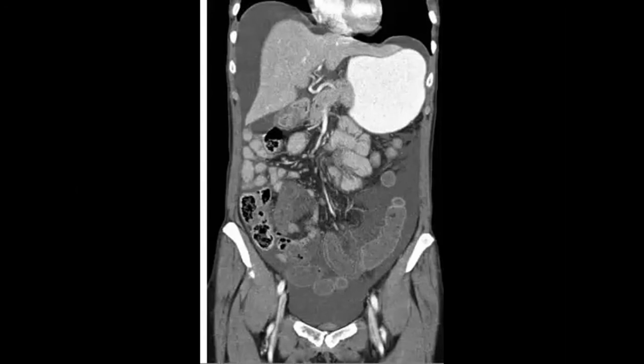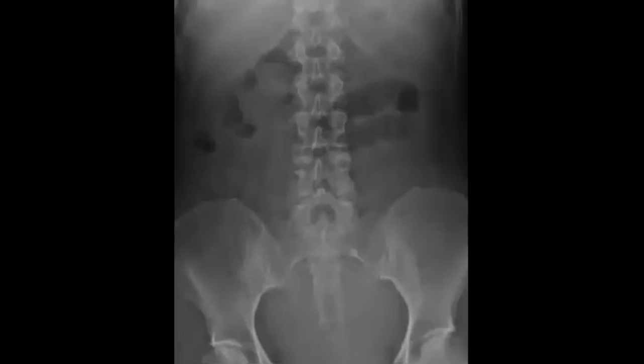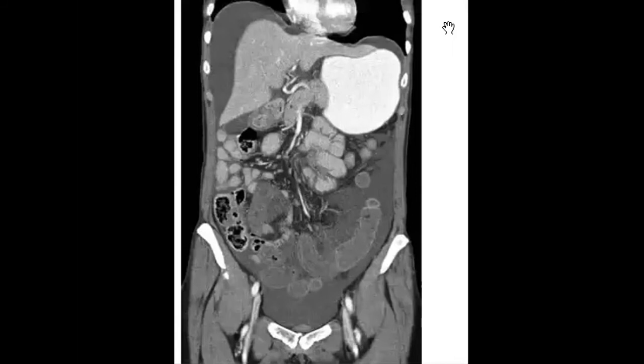Okay, 50% of cases of ischemia are secondary to thromboembolism. Other causes include bowel obstruction, volvulus, any tumor or neoplasm, vasculitis, radiotherapy, and trauma. In the early stages, as you see here in the abdomen, it can be dilatation or it can be normal, okay? So sure, CT post contrast, as I showed you, is the most helpful to diagnose these cases.